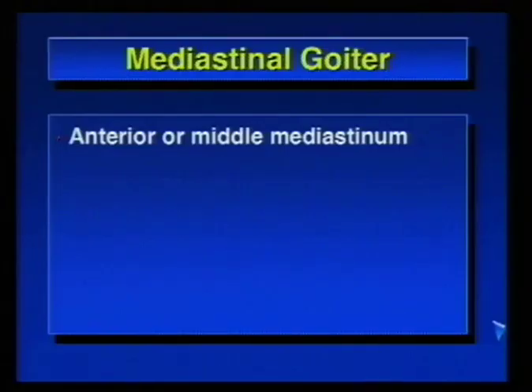Okay, let's move on. Goiter. This can be in the anterior mediastinum. Classically, people talk about anterior mediastinal masses that include goiter in that differential, but middle mediastinum is an important location for goiter.